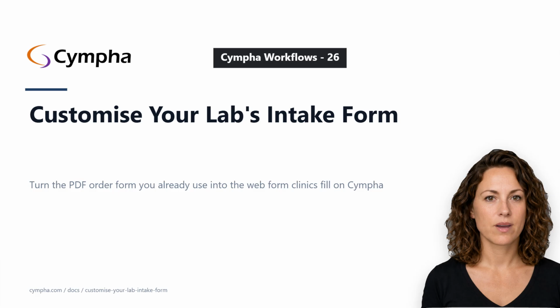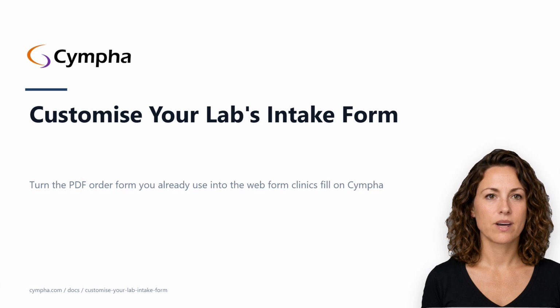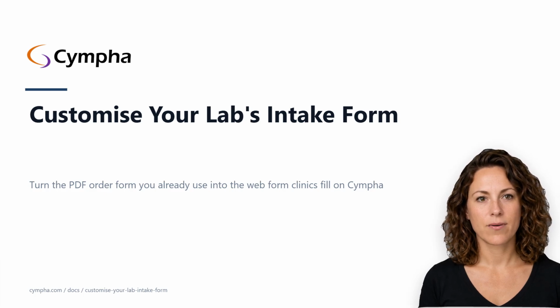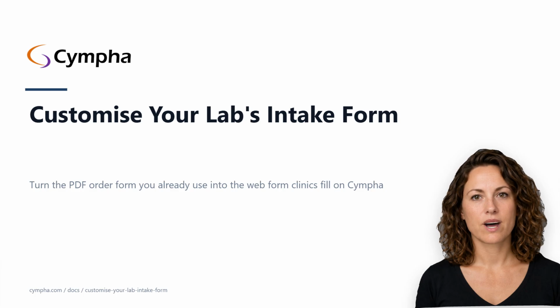This one is for lab managers who have finished onboarding and now want clinics to submit cases through their own order form, the form your customers already know, rather than the default Guide Mia intakes. By the end you'll know how to add a custom service to your lab, upload your existing PDF order form, let the AI turn it into a structured web form, preview exactly what clinics will see, and decide when a custom form beats the native template.